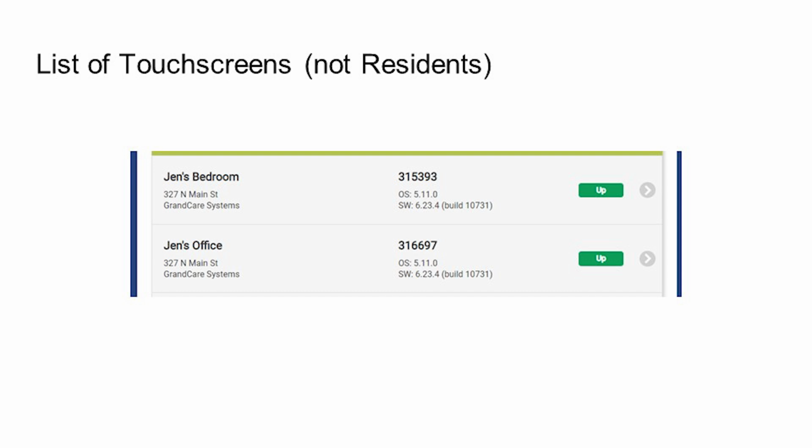And you'll notice as well that there are other indicators in this list, a number corresponding to the touchscreen's ID. And even at the bottom of the name of the touchscreen, there's something that looks like an address as well. We won't get into that just yet.